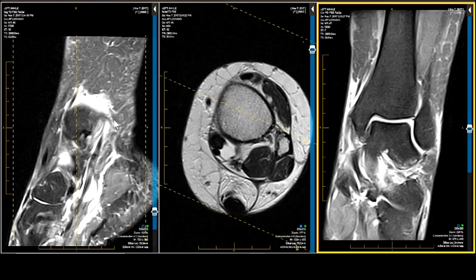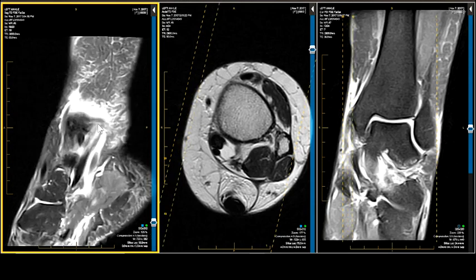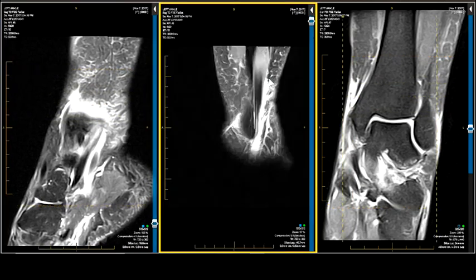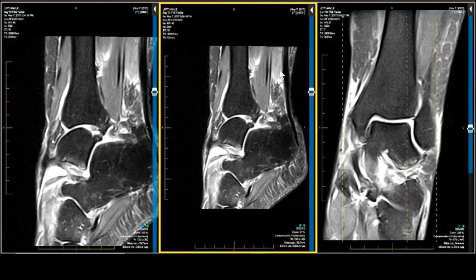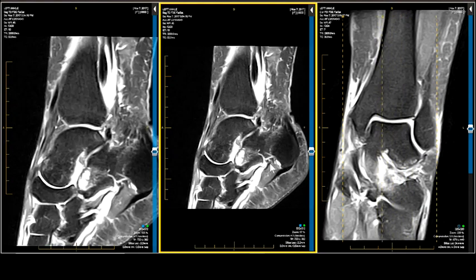Why do they have dysplasia? And there's your nasty, chronically torn posterior tibial tendon. There are probably 20 findings in this case. Even the Achilles isn't normal, right? Achilles is too fat. Look at it sagittally. It's a little tendinotic. See, it gets a little fat up there. That shouldn't happen. Shouldn't go from thin to fat. Plantar fascia is a little swollen. Okay, so what?